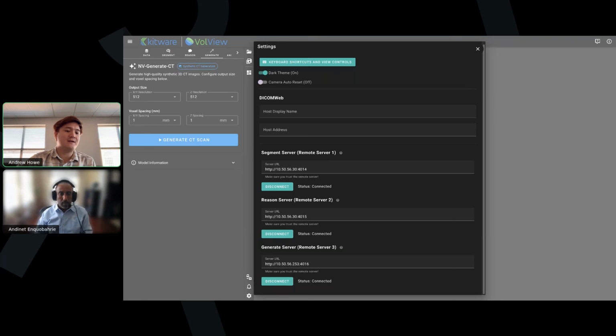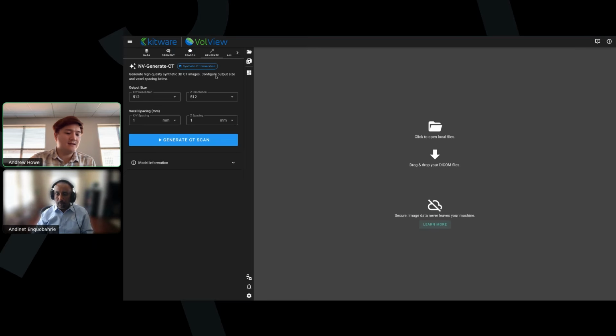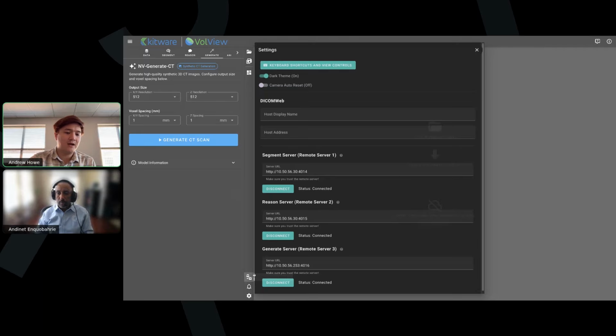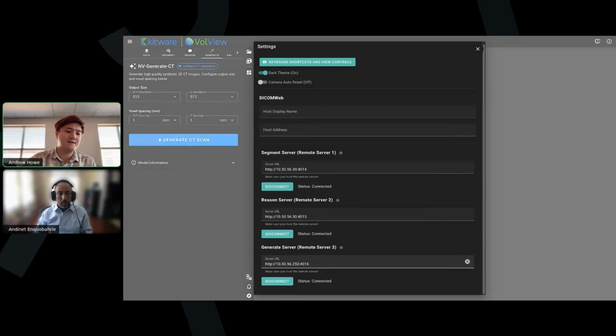And there's a WebSocket connection being made remotely, and a function call is created by RPC, which is remote procedure call. And so when you want to generate a 3D CT, we have a server running a Python instance that will receive the parameters. It'll generate the CT and send it back to the client over the WebSocket.